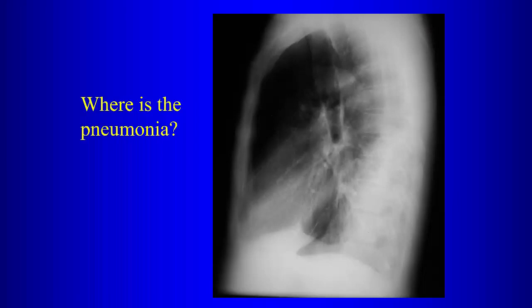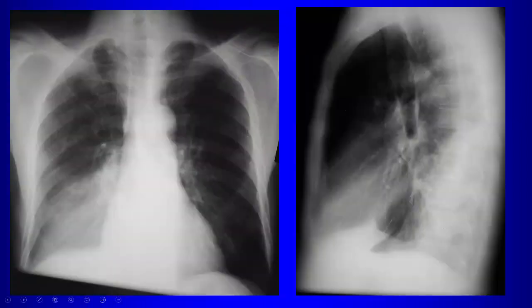It's the left lower. It's the right lower. So which is it? I got one vote for, well, I mean, we agree that it's going to be lower. There's a spine sign. So the question is, is it right or left? Right. All right. So why?